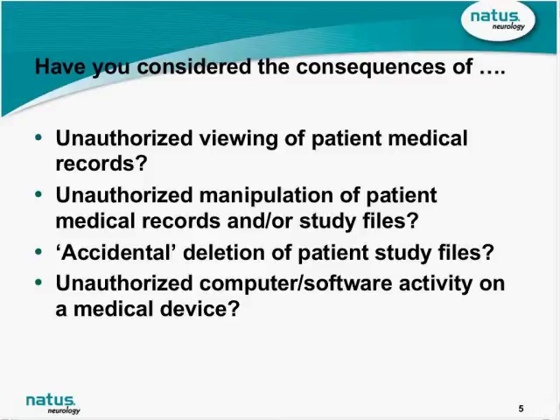Have you thought about the possibility of someone walking by and possibly even manipulating a patient record? If you've got a patient file or patient record open in the database, could someone simply go in there and change some information? Have you considered the possibility of someone accidentally deleting a study file while their database is open?